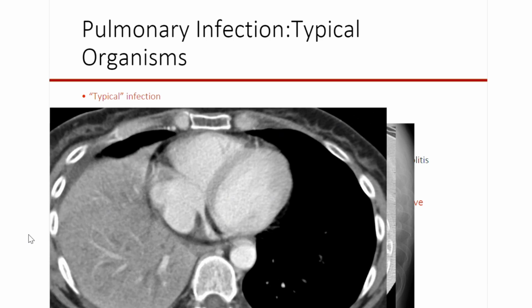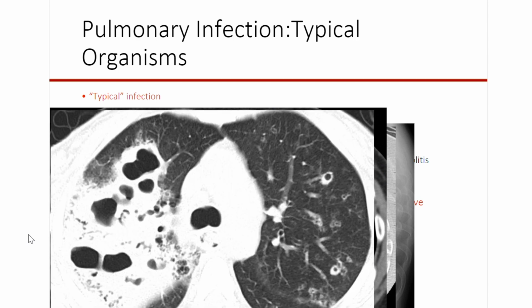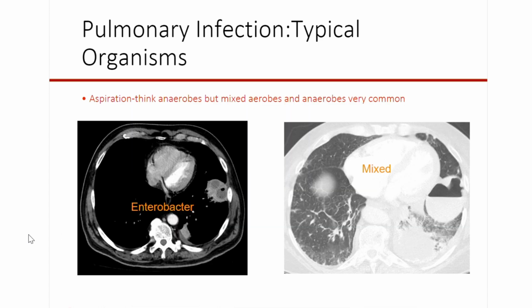This came back as pneumococcus. How about this? Complete consolidation of the right middle and right lower lobes. Boring imaging. Came back Pseudomonas. How about this? You better believe that I dictated this as, this is terrible. This patient has fungi and viruses. I don't know what this is. Look what it came back as: MRSA and E. coli. Again, 10% of bacterial disease can have atypical manifestations on imaging.